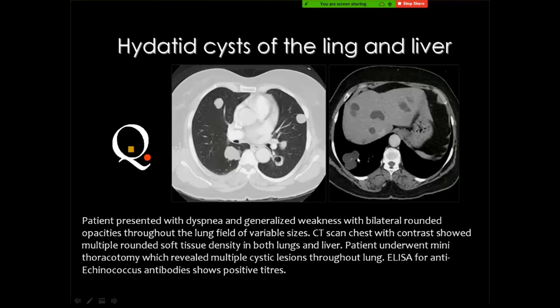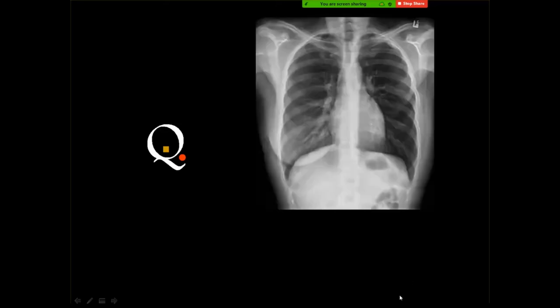They are cystic, containing clear water density with a paper-thin wall, and the only cystic lesion filled with fluid in the lung is the hydatid cyst. If these are hydatid cysts, then the remaining will be so, and also those in the liver are the same.